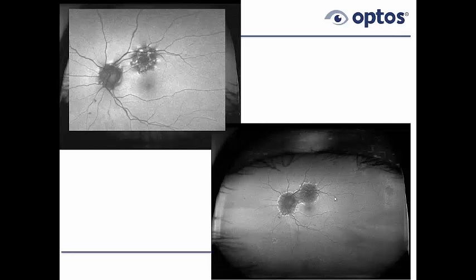Well, if you get a good image without dilating, I'm pretty happy with that. Certainly something we came up with years back is that best is both. It's always best to do ultra-wide field imaging along with dilation. But there are many cases where the autofluorescent imaging and the standard color imaging is giving you so much information without dilation that dilation probably is really not necessary. So it's like, do you want to put somebody through it? And a lot of patients, if they're given the choice, would prefer having the autofluorescent images.